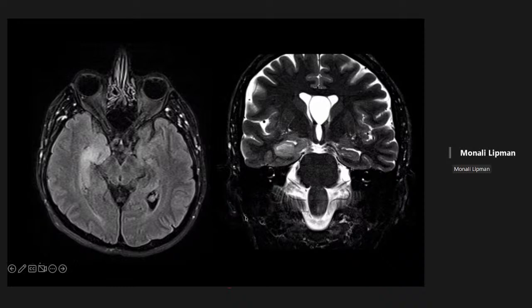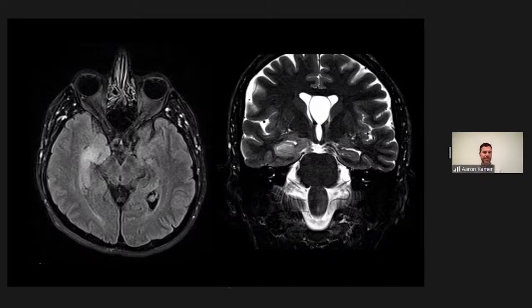I'm thinking like... no, I'm blanking on the name. Yeah, you're under pressure. No worries at all. So herpes, herpes. Okay, so herpes simplex might be another thing that we'd really strongly consider on this patient as well. Yep, with an edematous hippocampus.